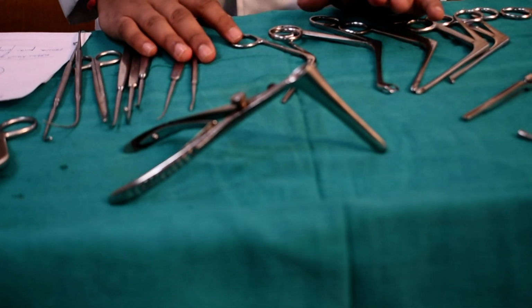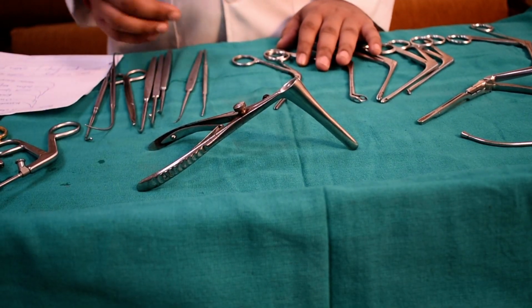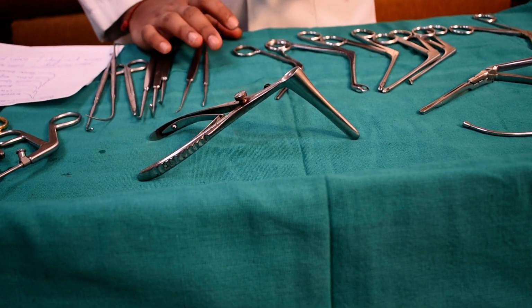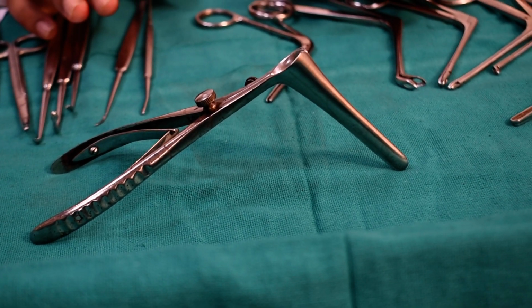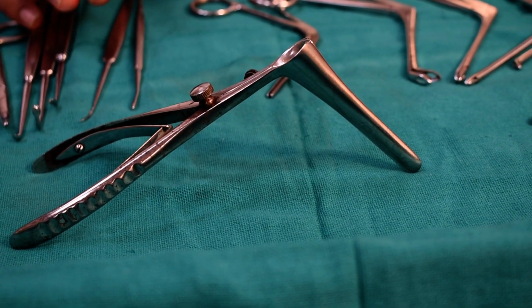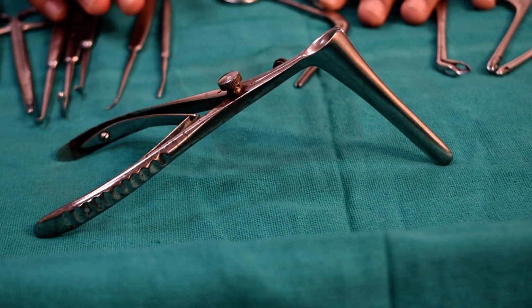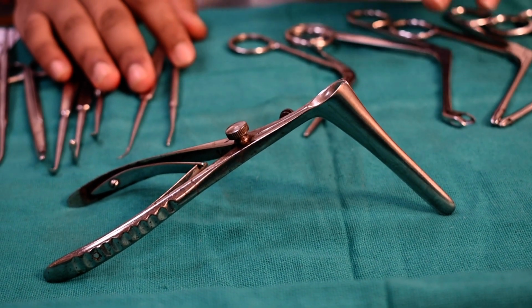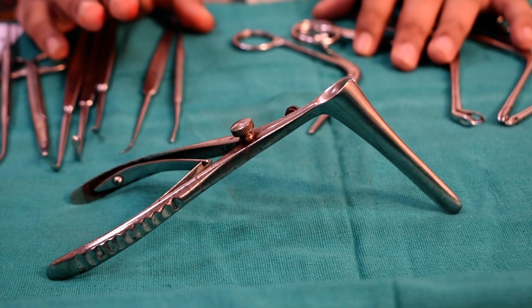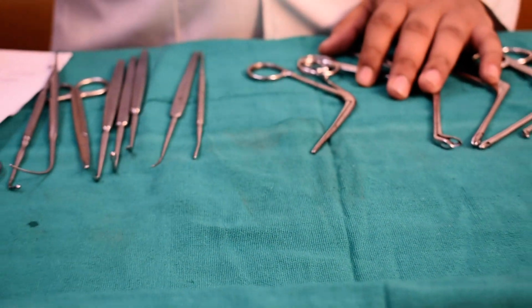There are many types of speculum, but surgical speculum are slightly different from those speculum which we use in OPD. You must know about the Thudicum's nasal speculum, named after JLW Thudicum, which is held in the left hand. Everyone knows the technique of holding it. After that, we have a longer version of Thudicum's nasal speculum known as the St. Clair Thompson nasal speculum. Other speculum we don't have.